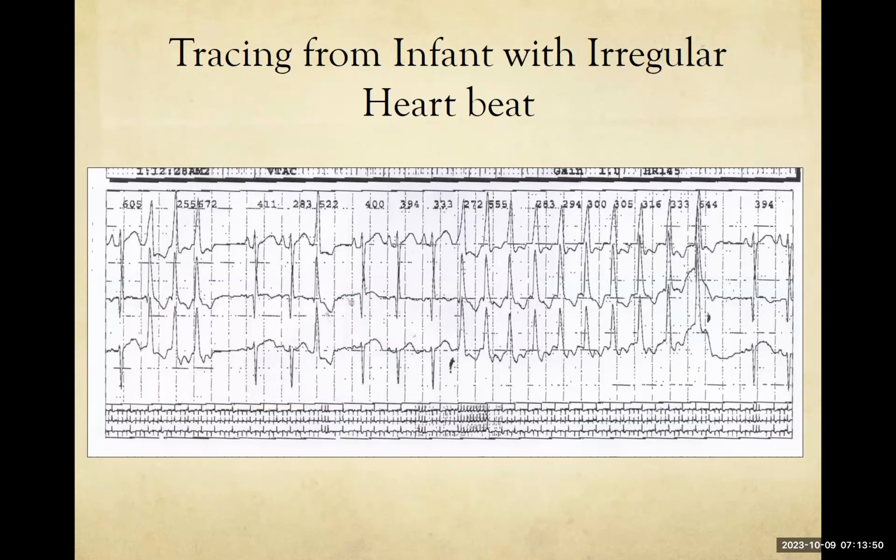So, okay, you see this on an EKG. How would you evaluate this patient, Maya? What would be involved in the evaluation and then potential treatment of this? I guess the first thing I would think about is accelerated ventricular rhythm of the newborn, given the history. I think this is something that is generally benign and resolves. But given that we have seen this abnormal rhythm, I would probably do an echo on the kid just to make sure we're not missing anything.